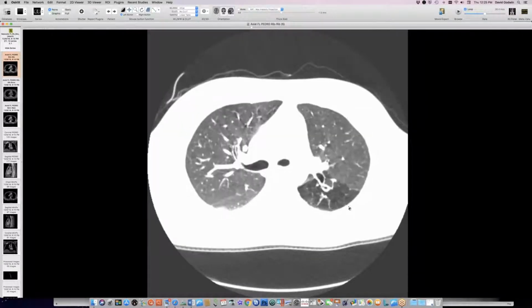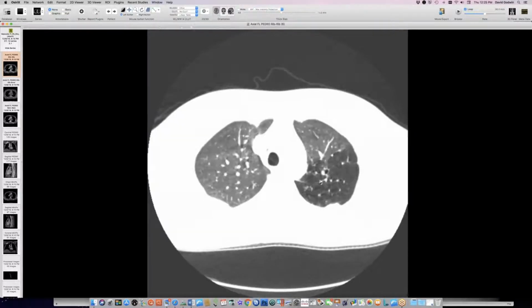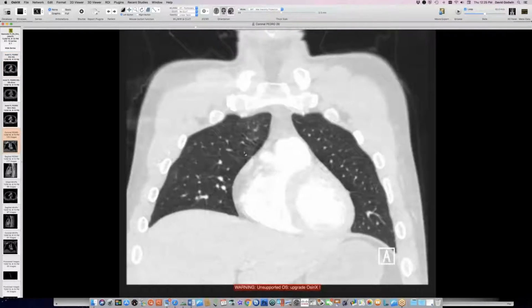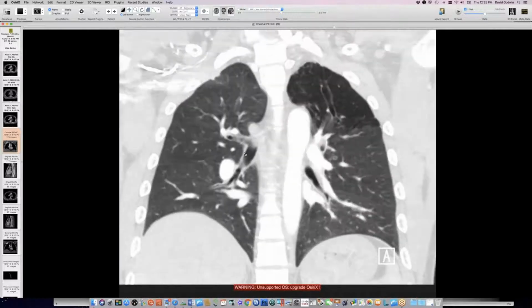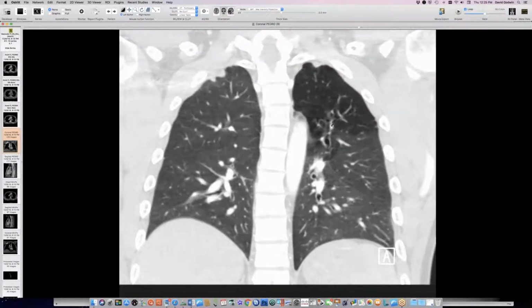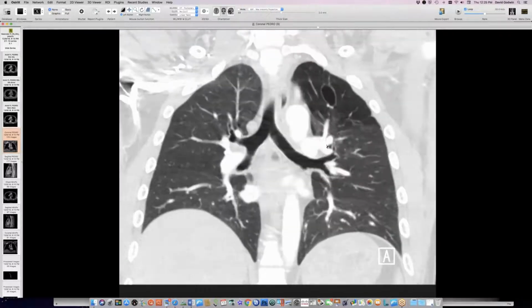And this air trapping in the lung around it. So I don't know what happened to the mucus plug. That would make the pattern complete. And coronals are nice in this, because you see the local, pretty well-defined region of hypoattenuation, the dilated central bronchus, which then goes to nothing, doesn't connect up nicely with more proximal bronchi.